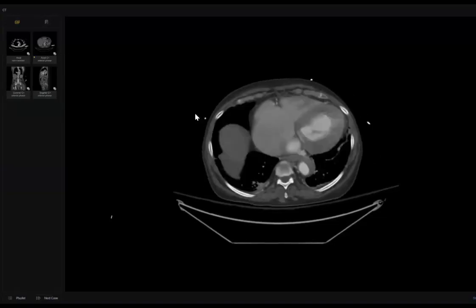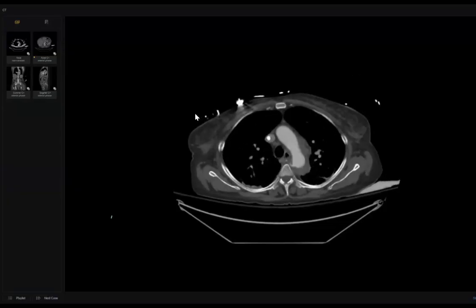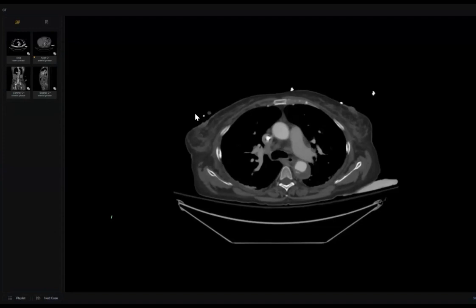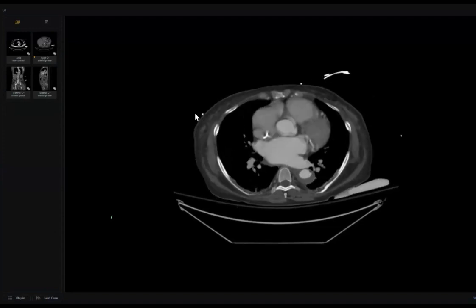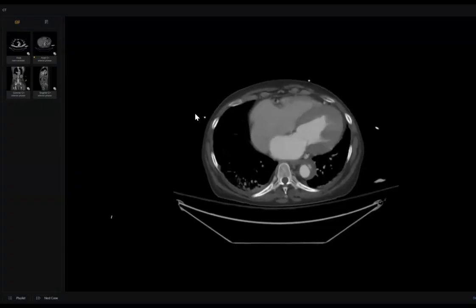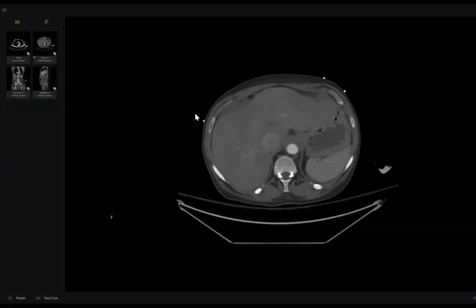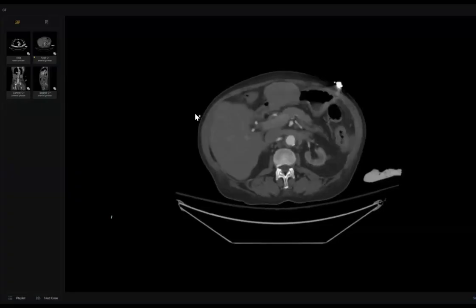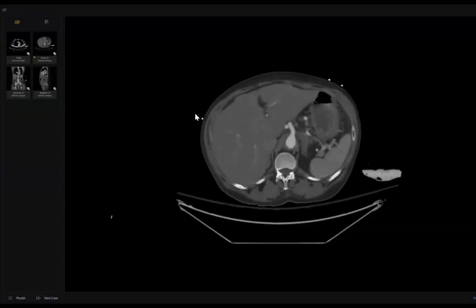Okay, these are the post-contrast images of the patient. There is a significant thickening noted around the ascending aorta, arch of aorta and descending thoracic aorta with plaque. Yes, there is a small aneurysm noted in the descending aorta also. So it is most likely representing, and now I will see the continuity. There is mild hypoperfusion.